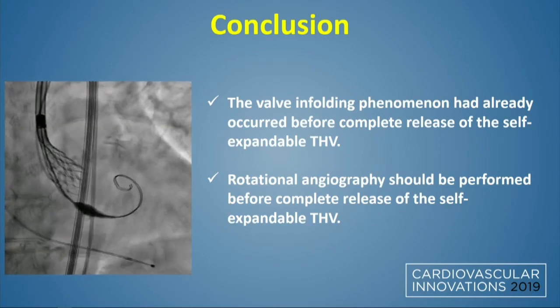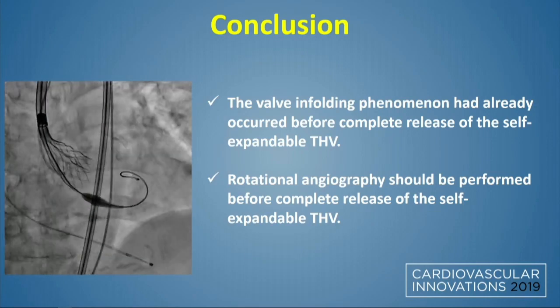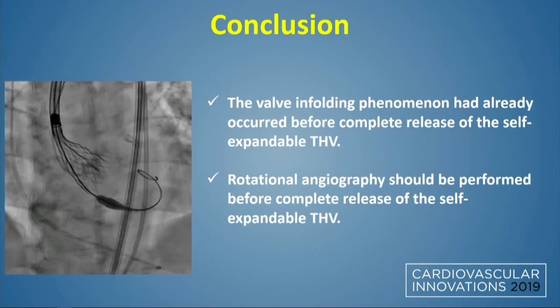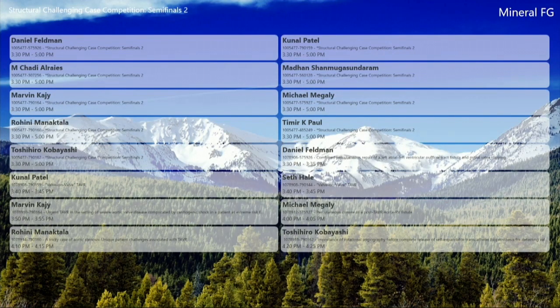In conclusion, the valve enfolding phenomenon had already occurred before complete release of the self-expandable THV. Therefore, rotational angiography should be performed before complete release of the self-expandable THV. Thank you. It happened in 0.6%.